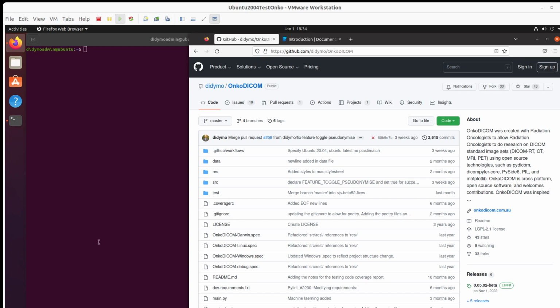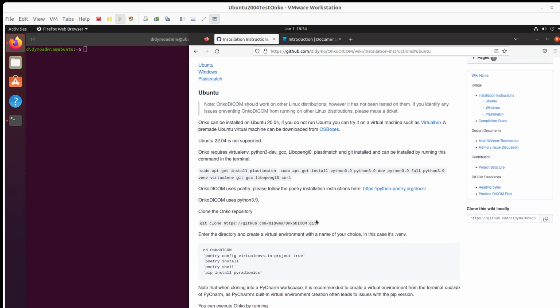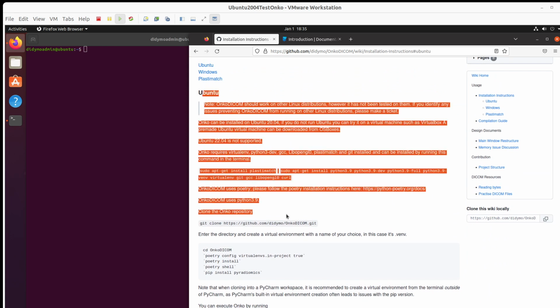The second video is the one just for getting OnkoDICOM cloned and working on Ubuntu 20.04. Please see the first video to have your underlying system with all the dependencies. That's what this video is getting ready for. So we go to the wiki and Ubuntu, and you'll see that the first video covers this section here.